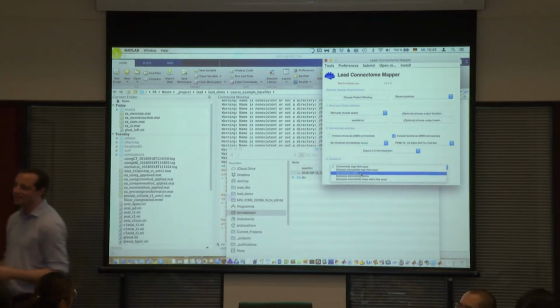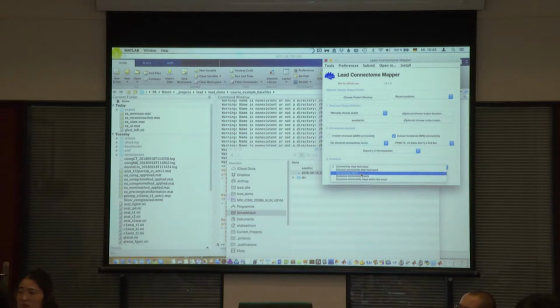Sorry, if we run it from connectivity visualization, is it the same? From connectivity visualization from the render? It doesn't give you the maps, no, it's not the same. So it's a different output actually. So we should do that after if we want to. Yeah, it depends. I think the visualization is really just about visualization. That's why I think I told you yesterday we don't really use it that much. But this is basically to do stats and so on.